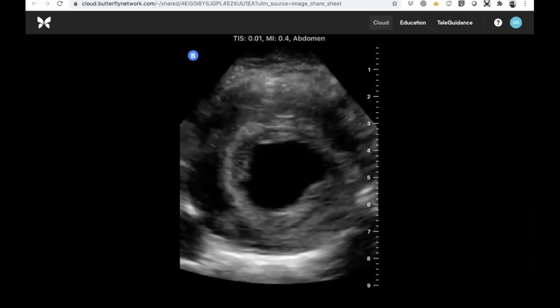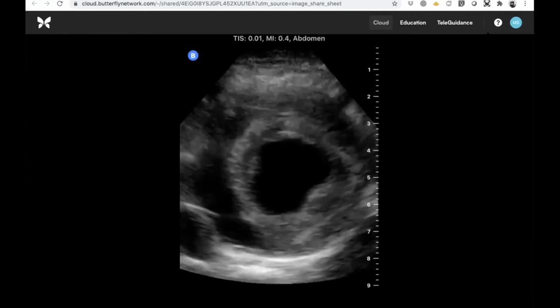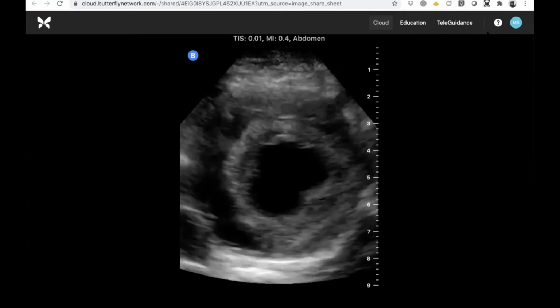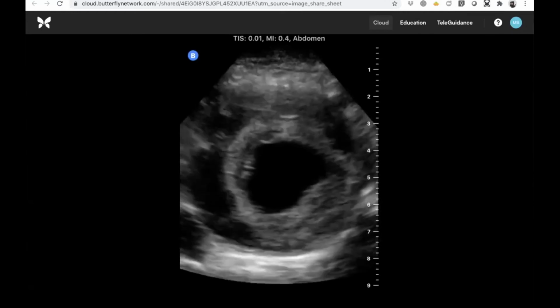So always a good tip to make sure you're looking at everything in 2 planes. I think there's occasional exceptions. We get away with 1 plane for some lung imaging. We get away with sort of 1 coronal plane in a sweep for some of the FAST exam stuff. But in general, 100% agree, 2 planes for everything you look at.